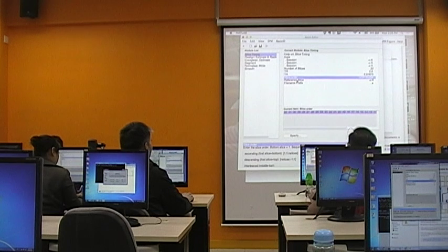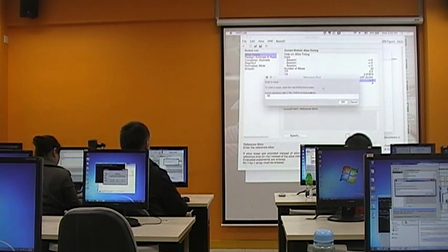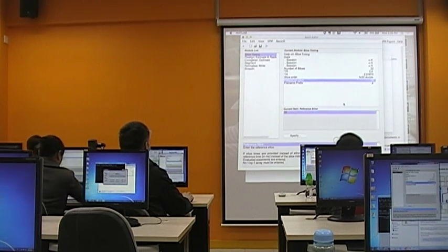And the reference slice. Usually you take the middle slice as the reference, so we are taking slice number 16. This slice order means that 32 is the last slice. Okay, so this is slice timing.